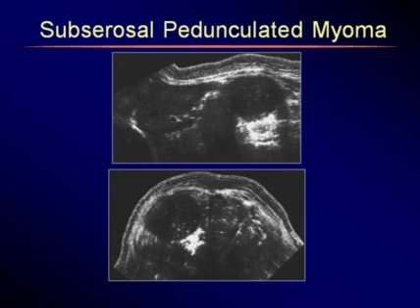Now some of these pedicles, these stalks, can be very thin and long. Years ago, in the days of static scanning, and I often like to throw in a static scan just to remind us of the history of ultrasound, how far we've come with our technology, this woman had a mass that wandered around her abdomen and pelvis.